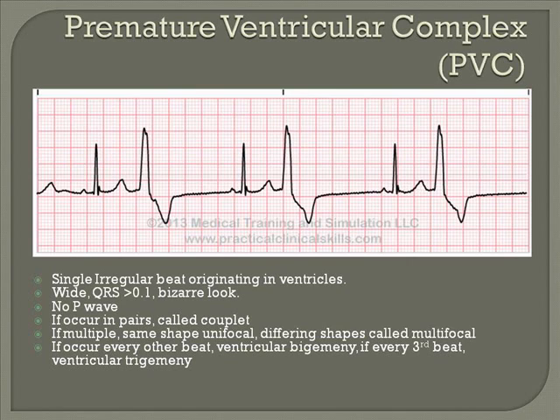If it happens to have a wide complex, then it becomes a PVC, a premature ventricular complex or contraction. This is originating from an otherwise narrow QRS rhythm, such as a sinus, atrial, or junctional rhythm. When you look at this strip, you notice that every other beat looks significantly different than the underlying ones. Now we look at the P wave. The narrow QRSs all have P waves, but the wide QRSs do not.